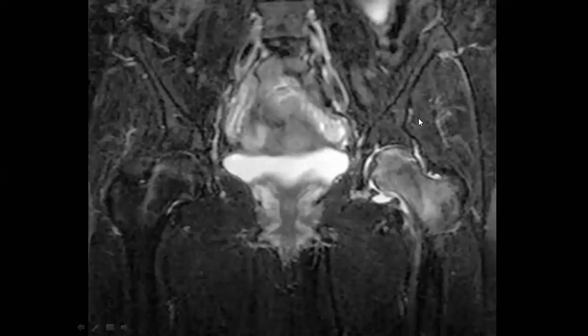In the STIR image, edema, some effusion, okay, but the most important thing to mention is the edema, because this is a STIR image, and it is very sensitive to fluid. So when you see this image and you want to describe it, mention whatever you like, but don't forget to write edema, okay? Then the differential.